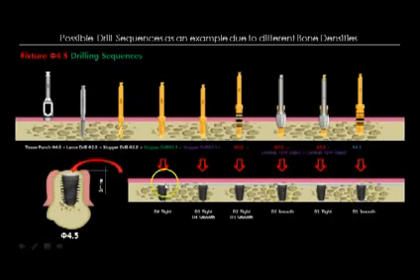Okay, so D1 tight, and then your 4.3. You can tell if you have to drill out to the 4.3, because remember, here's your 4.5 implant, 4.3 drill, you know you're in D1 bone. So again, that is your drilling protocol for D1 bone. So now you see the different variances that you can run into.